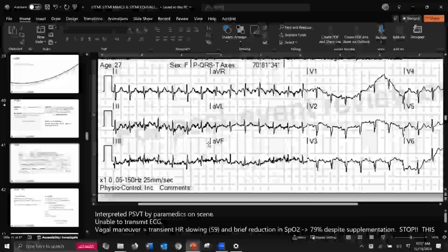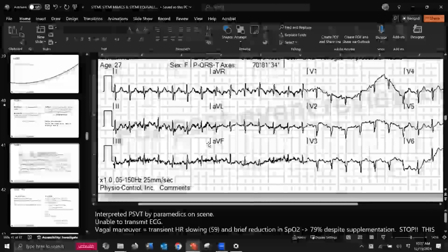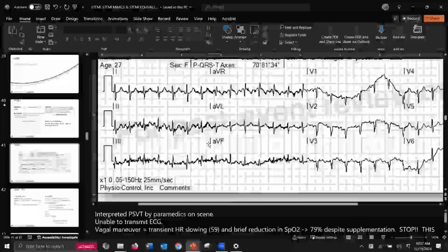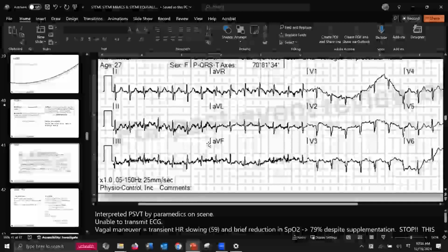Historically, think about this. She's a young, healthy female who's been to two separate urgent cares, right? They haven't caught it, they haven't treated it. Now she's having crashing symptoms, so she calls 911. I think somebody said it, yeah, Steph Harms said pulmonary embolism. This is an ACLS kill. They did the right thing by ACLS to slow the rate. They gave her adenosine. They eliminated her cardiac ability to compensate for an underlying pathology.